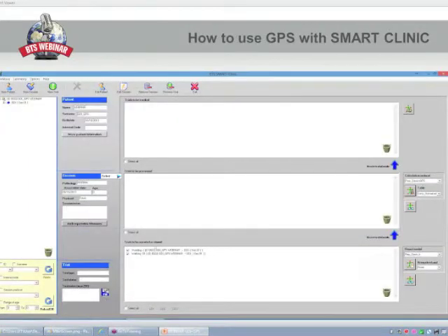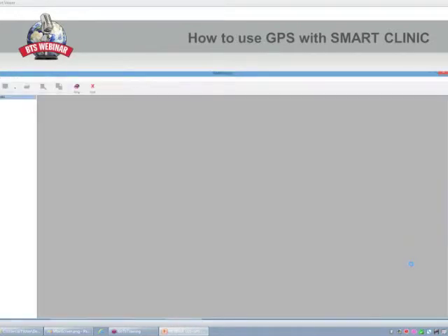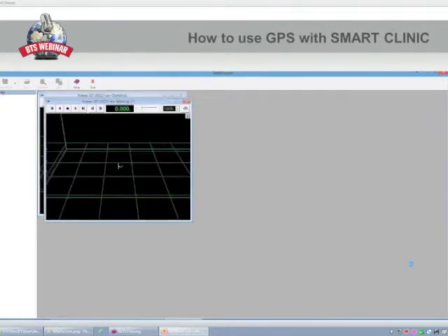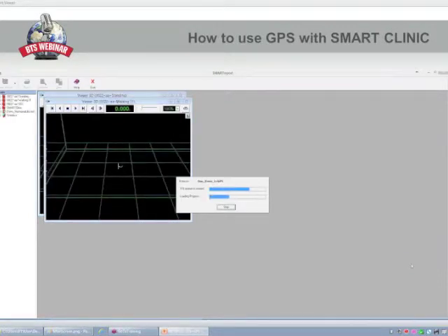And so the data are now ready to be analyzed by means of the report. So now I'm going to select one of the available reports containing the information about the GPS. I also have to select the normative band. All this information, all this data will be loaded automatically into the report.